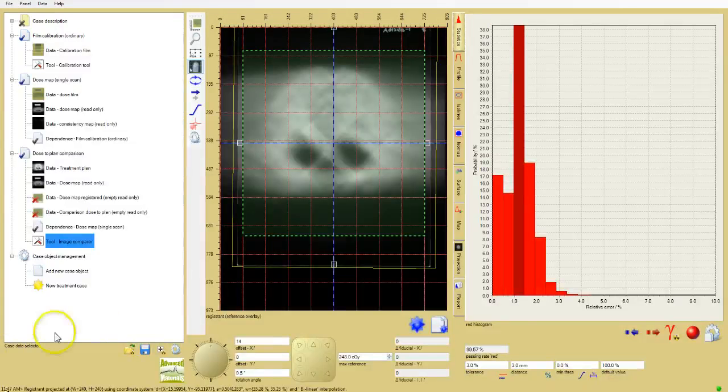At this stage, the results of the gamma analysis show more than 99% of pixels passing with the default test criteria of 3% and 3 millimeters. However, at 3% and 3 millimeters, the test is usually insensitive for most IMRT and VMAT plans, since shifts of 2 millimeters or so in the alignment of measurements to plan usually have little effect on the passing rate.